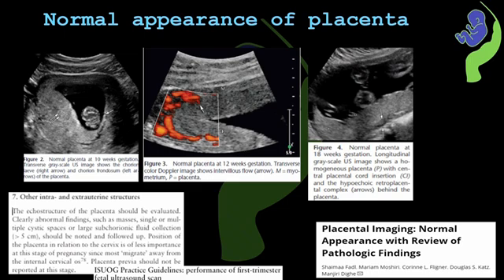As you can see in the first image on the left, the two arrows represent the hyperechogenic structure that is beginning to appear as the placenta. Between 12 to 16 weeks, progressive changes occur. The chorion and the amnion gradually fuse, and by around 15 to 16 weeks, this fusion is usually complete. By this time, the placenta is well formed and an important sonographic feature will begin to appear.